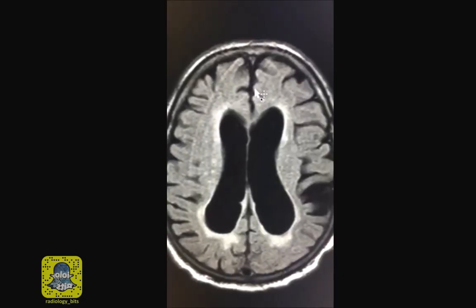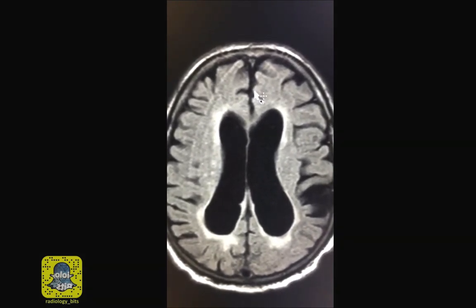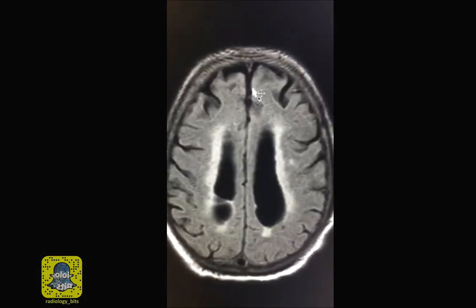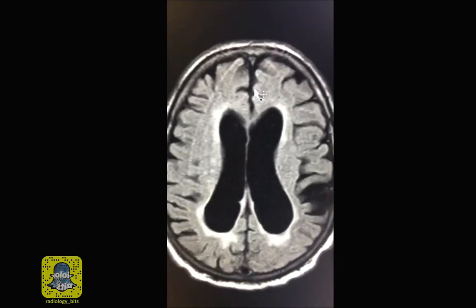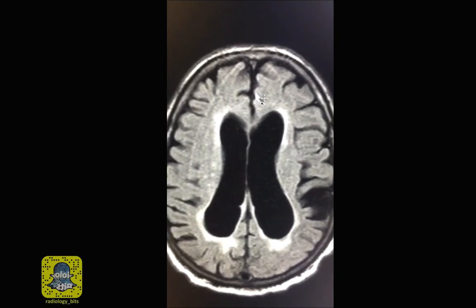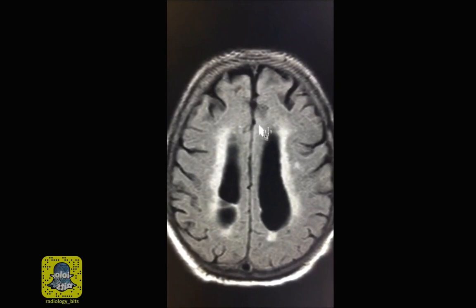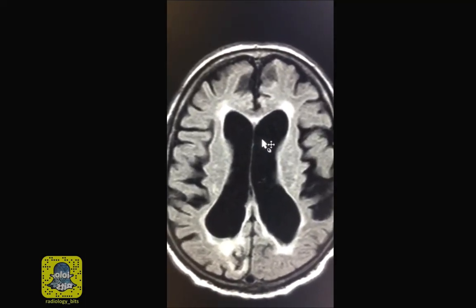There's an entity that represents a form of non-obstructive hydrocephalus seen in elderly that's known as normal pressure hydrocephalus, with the classic Hakim triad of dementia, gait abnormalities, and urinary incontinence seen in some patients, and where LP or shunting may be therapeutic if the diagnosis is made correctly. Correlating the image with the clinical picture is the most important, so don't overcall this entity.